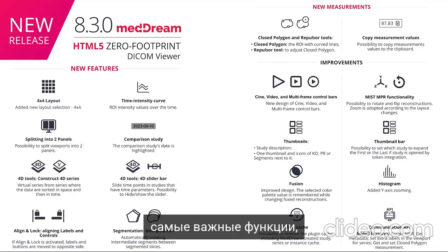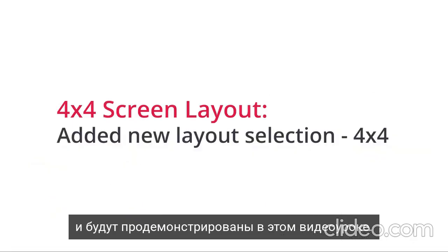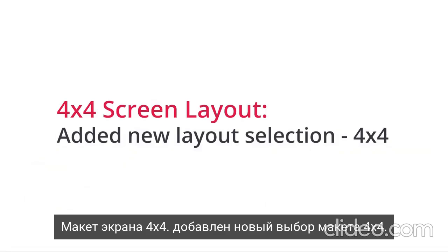The most important version 8.3.0 features, measurements and improvements are presented and will be demonstrated in this video tutorial. 4x4 screen layout. A new layout selection, 4x4, was added.